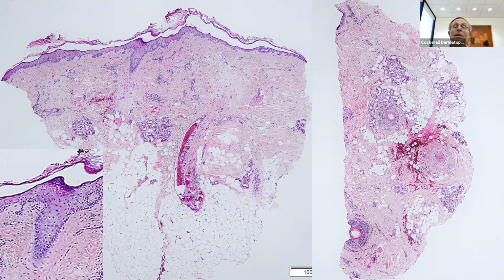Just tell the lab, cut one this way and cut one this way, and they'll do it, and they'll give you a section that looks like this where you can look at 20 follicles as opposed to here where you can look at about 6 or 7. So we like to get both because here you see more involvement. If you saw this half, it's kind of burned out. There's nothing to the left, so this is non-specific. But over here, you can see some changes. You've got some onion skin perifollicular fibrosis.